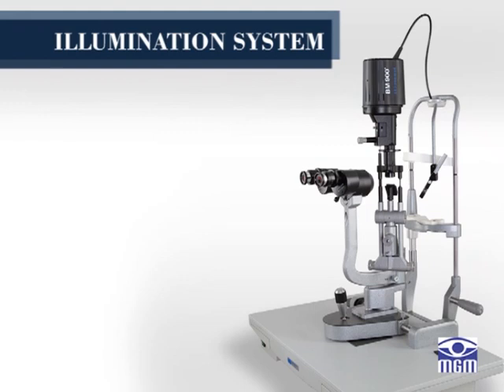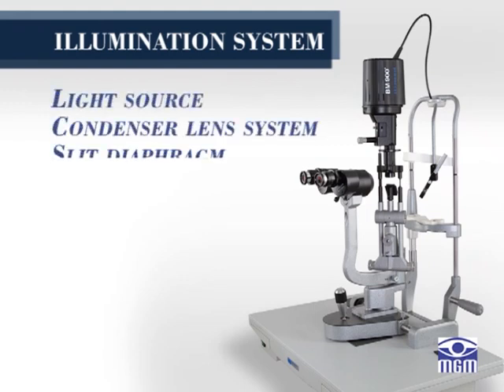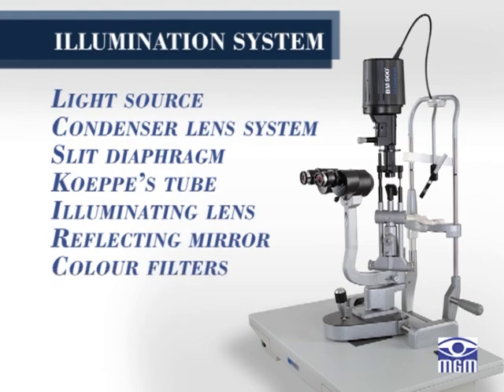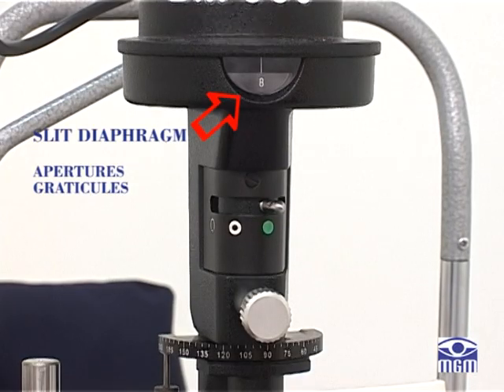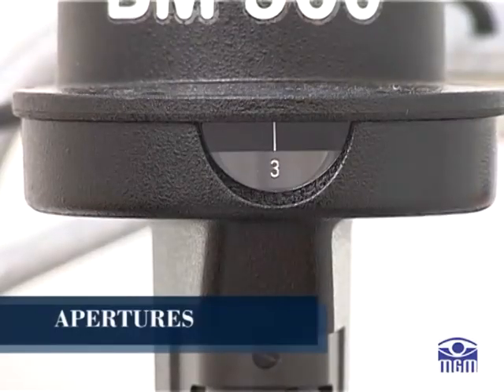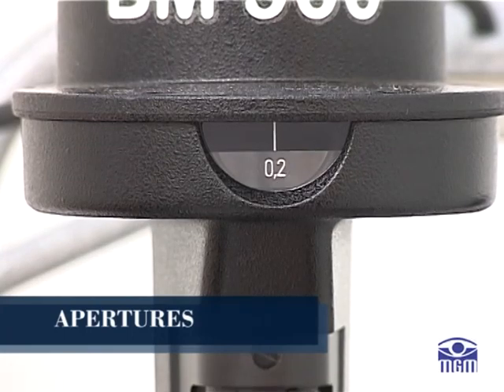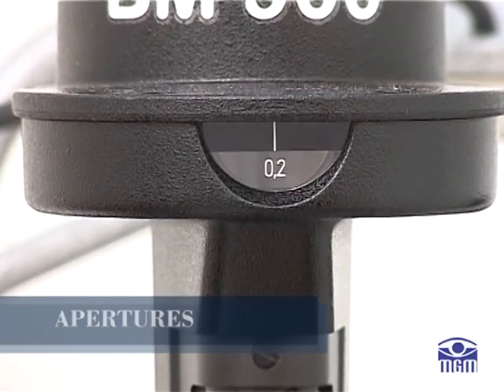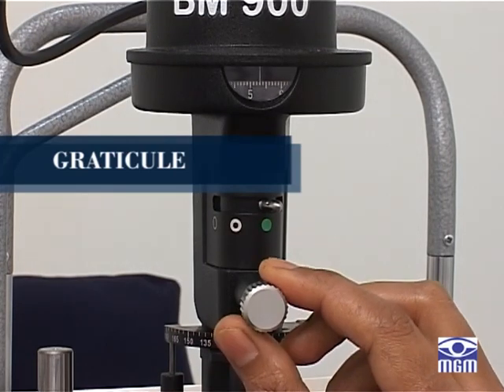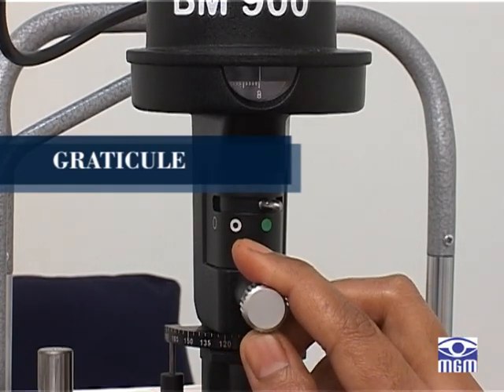The illumination system consists of a light source, condenser lens system, slit diaphragm, opaque tube, illuminating lens, reflecting mirror, and color filters. The slit diaphragm consists of apertures and a graticule. Apertures produce an area of 8, 5, 3, 2, 1 and 0.2 millimeters. The graticule consists of a wedge-shaped diaphragm for continuous slit adjustment in millimeters.